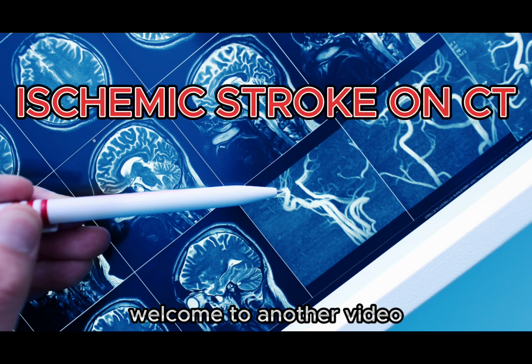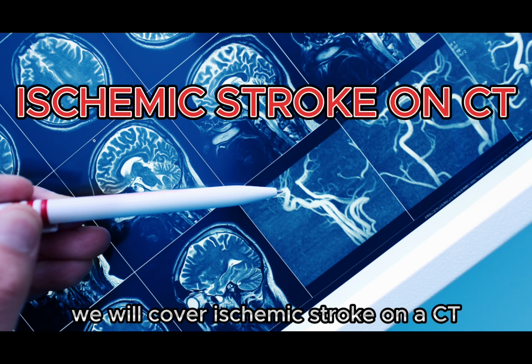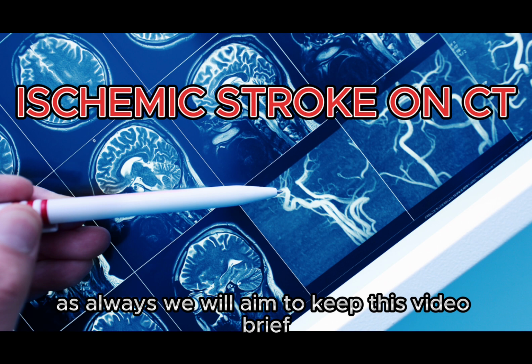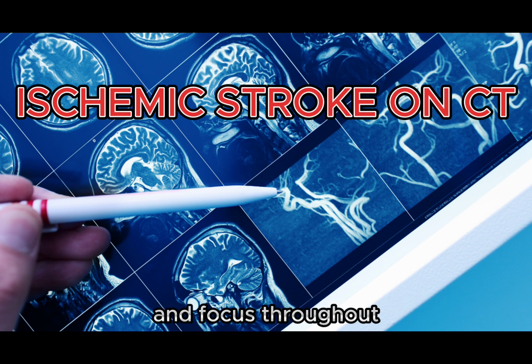Welcome to another video. In this video, we will cover ischemic stroke on a CT. We will provide you with common signs and imaging findings every student needs to know. As always, we will aim to keep this video brief and focused throughout.